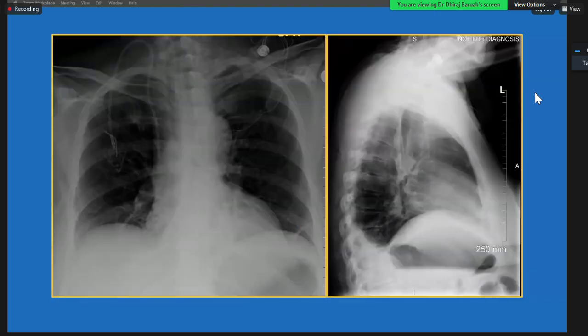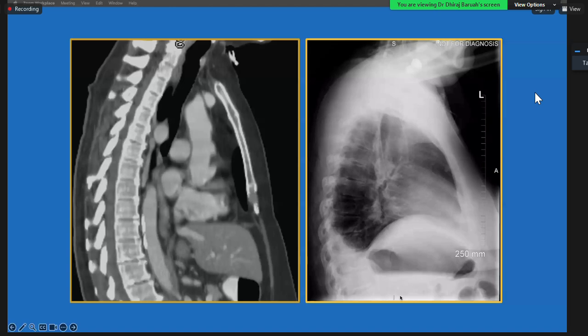So in this case, if you go a little lower, there is a pleural effusion, ignore that. If you go a little lower, you see something out there which is displacing the air-filled esophagus. So between the trachea and esophagus, if you see an abnormality, and if it is a vascular abnormality, there is only one diagnosis, okay? If you see that CT sagittal reconstruction, this is a vascular abnormality. There is only one vessel that crosses between the trachea and esophagus, which is a developmental anomaly. So you guys can think about it. And if you do not know it, then remember that is the vessel that crosses.